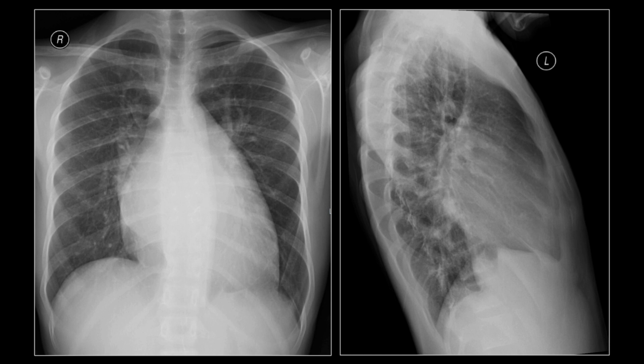And would also be an obstructive lesion, such as myxoma. Now, a left atrial myxoma is not common in practice. However, this is one of the exam favorites, since the examination would start with the chest radiograph and then take you to other imaging, such as CT and MR, to discuss cardiac masses. Don't forget that dilatation of cardiac chambers could also be a result of shunts.